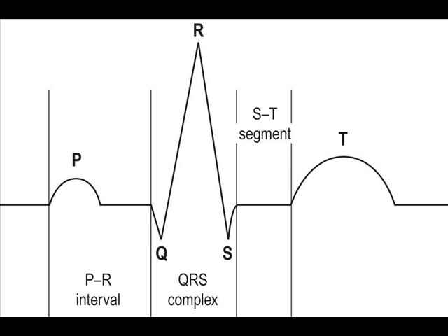Then you see the big QRS complex. Just run it together, QRS complex, and that represents depolarization of the larger ventricles. Then there is a pause, the ST segment, and then there is electrical resetting or repolarization of the ventricles, represented by the T wave. Of course, there is repolarization of the atria, but that occurs underneath the QRS complex, and that is one heartbeat represented electrically.